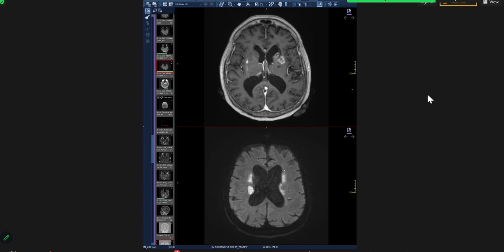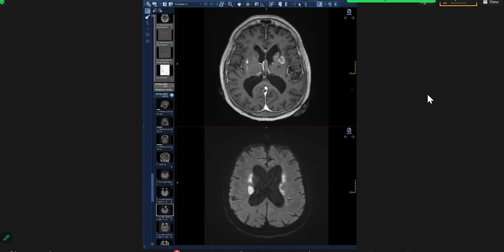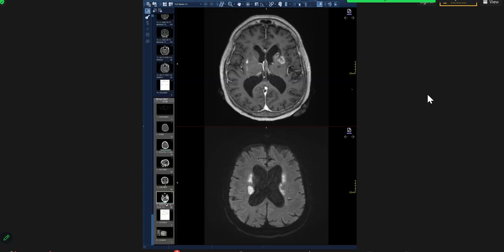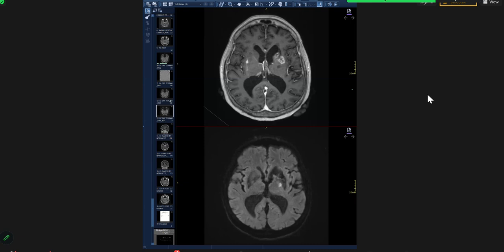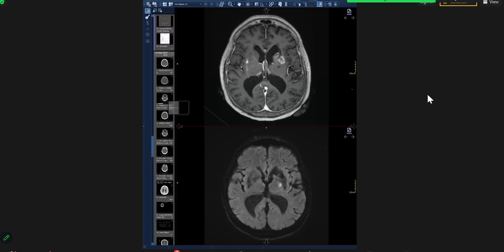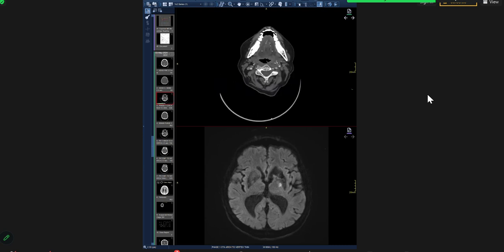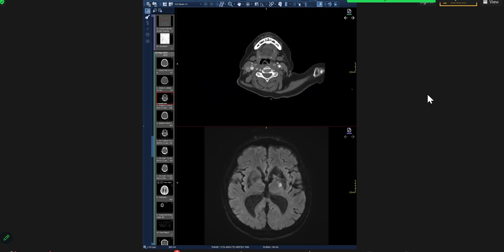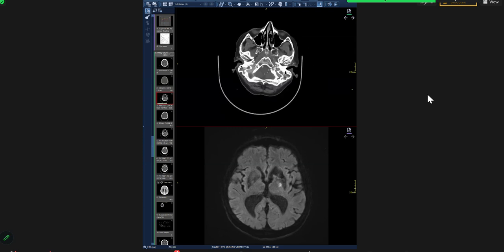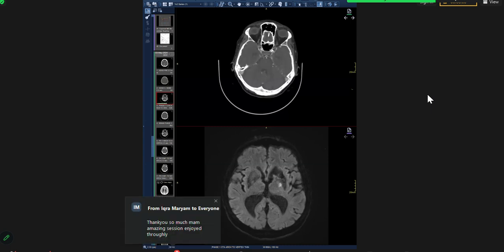So the carotid at the base of skull is also atherosclerosed. So there would be atherosclerotic changes everywhere. I have a companion case I can show you really quickly, which is a brain abscess. One minute. Let's see the stroke. So somebody's asking if there is atherosclerotic disease. Yeah, so it has atherosclerotic disease at the bulbs, but otherwise at the skull base, no. At the skull base, the carotids look okay. There is some atherosclerotic disease.